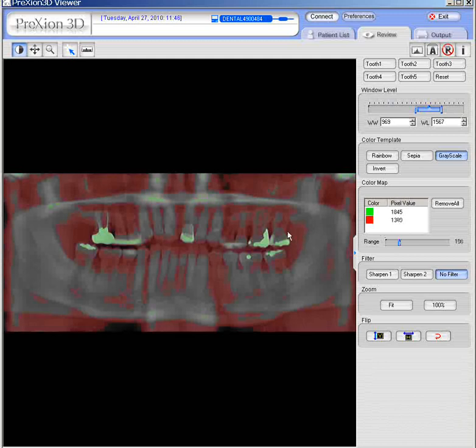And so again, you can also click into the field of view and change colors that way if you wish to add, or you can remove them all just by clicking remove all. You remove all and you go back to your original setting, which most people like anyway.